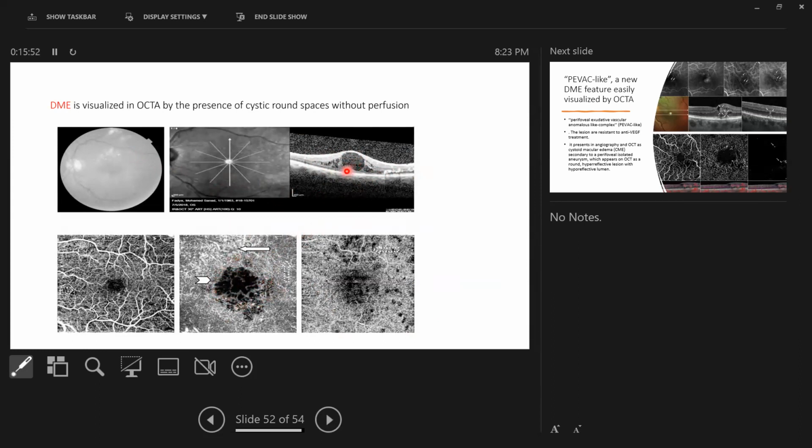That's why, as we mentioned before, usually the large cyst will cause a worse prognosis. Why? Because the large cyst will press on the peripheral vessels and cause more ischemia. So this is why the large or giant cyst has more impact on the vision than the small cyst.